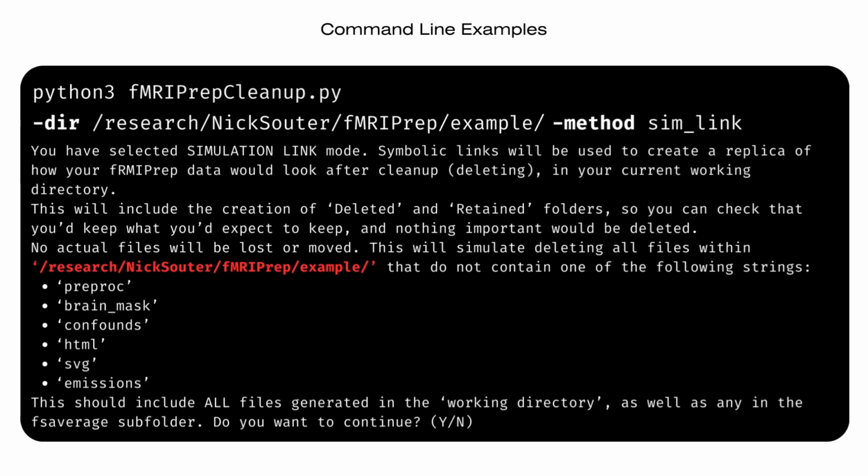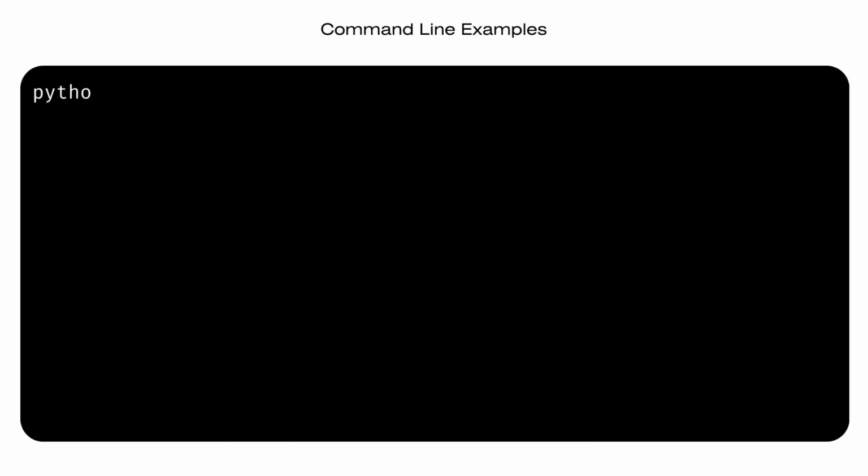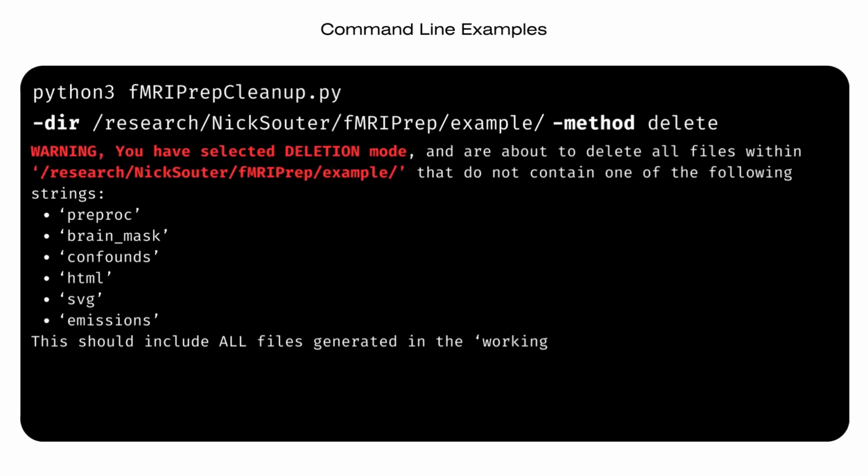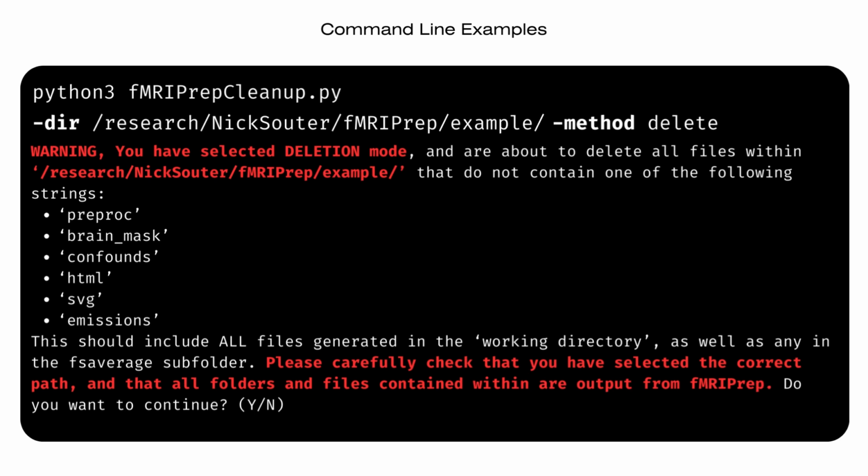All looks okay, so I repeat the above, but this time using the delete method, so files are actually removed from the original directory. Again, I'm warned about what will happen and asked to confirm that it can go ahead. All unneeded files are then tidied up in the directory path I provided.